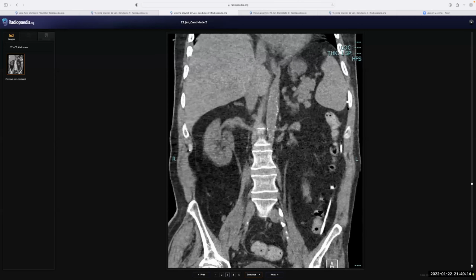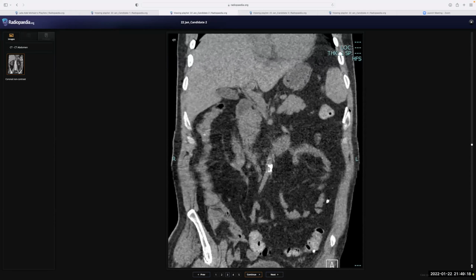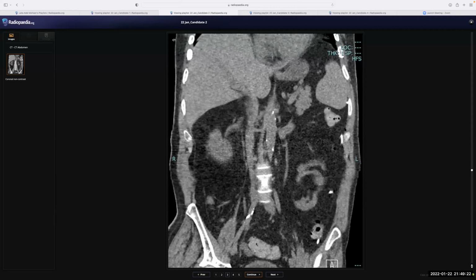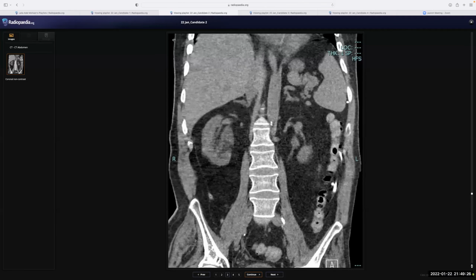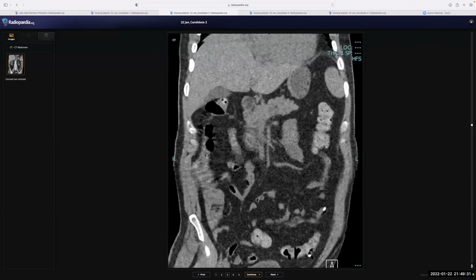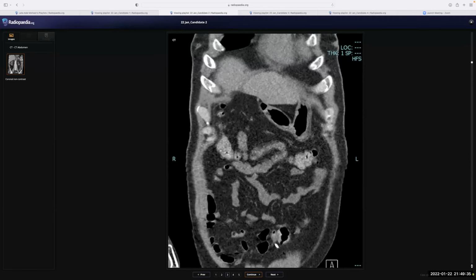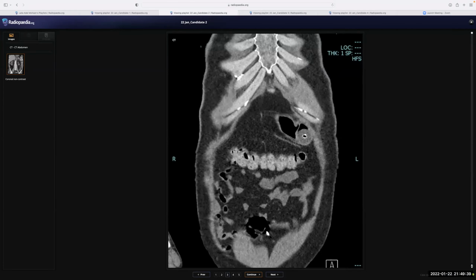It's going behind the spleen. And again, I'm lost. I really cannot ascertain the nature. For a moment, I felt that the distal end is entrapped within an air-filled sac, or is it forming an abscess with its distal end? But this seems to be small bowel loops rather than any.